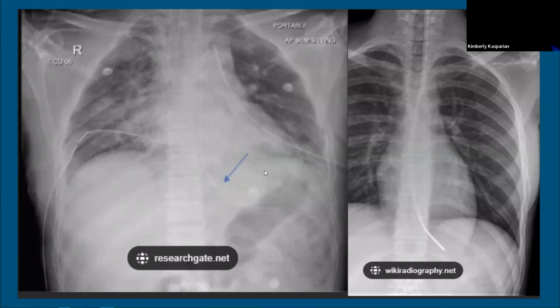Tell them to go forth and conquer. On the one on the right, would you tell them to advance? Yep, I would probably tell them, push that in like another 7 to 10 centimeters. Because worst case scenario, it's just going to kind of curl up in the stomach and it's somewhere you can use. And that's probably okay. I would just worry that the patient moves his head and then it retracts up here, and then it's a whole issue.